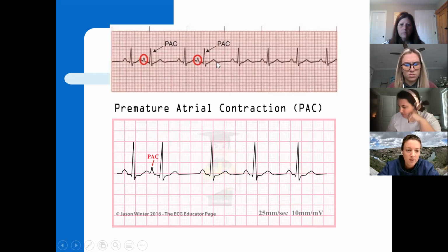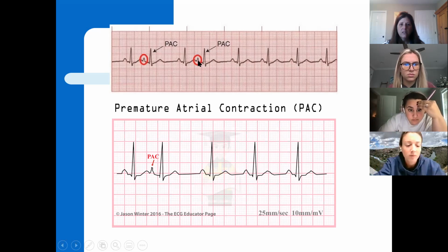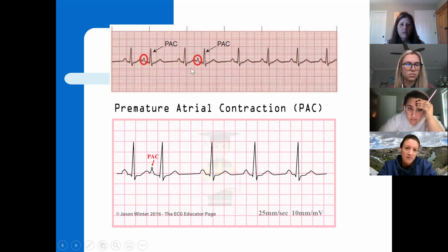See how this T wave comes back down to the isoelectric line? So if we draw, I'll try to draw with my mouse backwards. That T wave should be coming back down around in here somewhere. But before it can, that P wave is getting anxious and it's jumping in. Now if I look here, this looks normal. P, Q, R, S, T. Pause. P, Q, R, S, T. Pause. P, Q, R, S, T. Pause. See how that looks normal through there? We don't have enough of this previous strip to do the calculation and calculate that out. But does everybody see how this P is jumping in on the T wave territory?